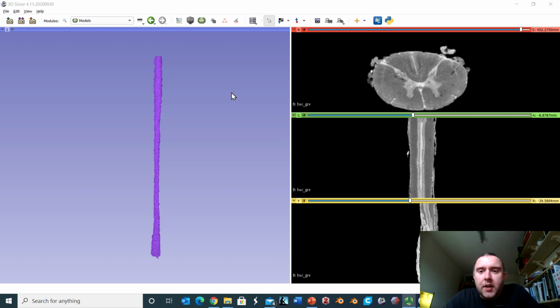Hello! In this video I want to take you on a brief tour of the spinal cord using a very special data set that was kindly given to me by Evan Calabrese over in the US. This data set uses a post-mortem spinal cord which has been scanned in an MR scanner at incredibly high resolution, and in fact the resolution is so high that we're getting essentially histological grade images from this data set.